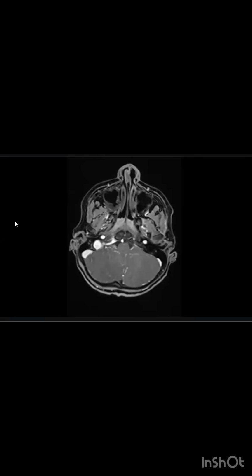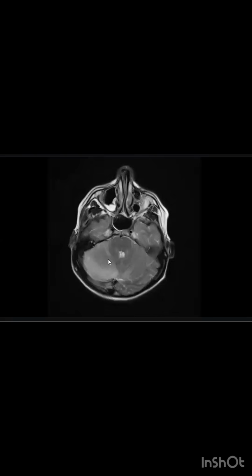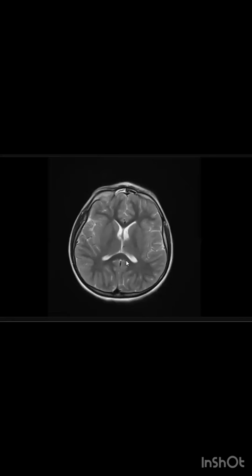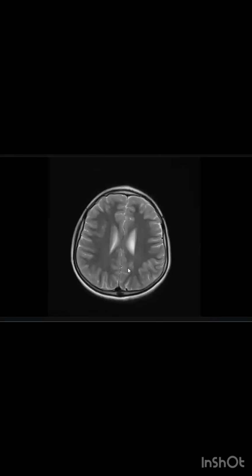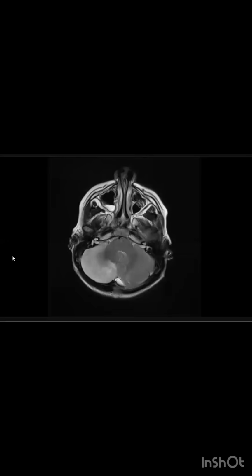I give you the case to learn from the previous one, but you go with the same differential. But here you see there is a swollen right cerebellar hemisphere, and you were told there is mass effect, okay, but you can still see CSF here. The basilar artery is still present. You can see the fourth ventricle slightly compressed, but not so much mass effect. So I don't think this patient will need intervention, because there is not so much mass effect here.